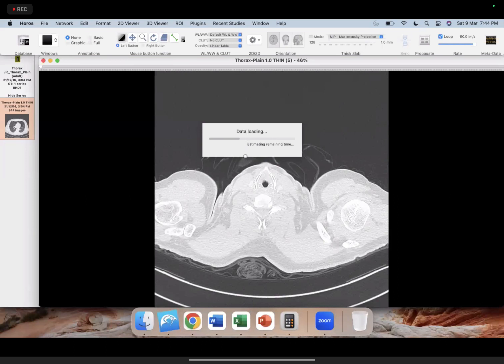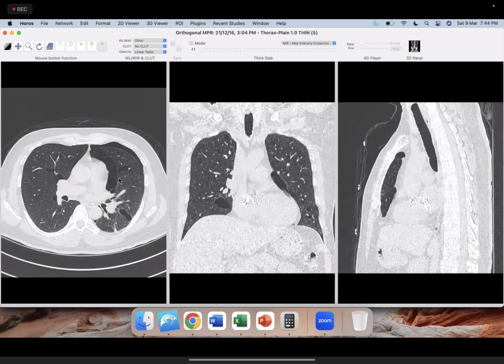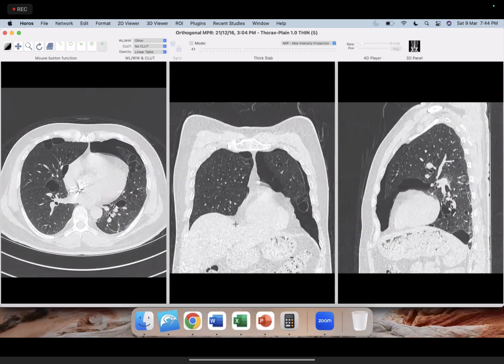So this again, now notice this is a cystic lung disease. Now you have that complication which can happen with any cystic lung disease, which is a pneumothorax, because any of these cysts can rupture anytime, and it is not specific to this condition or any of those described previously. Any cystic lung disease can have a pneumothorax.